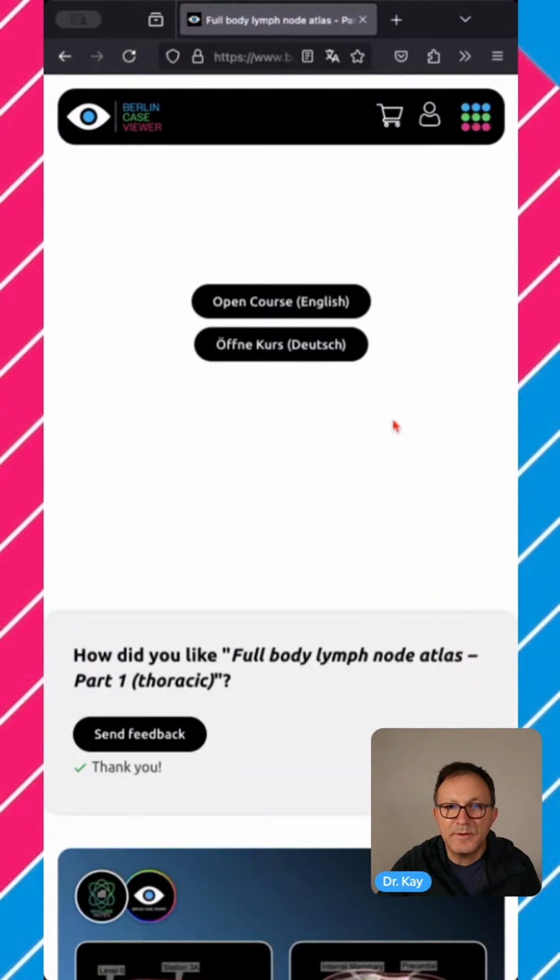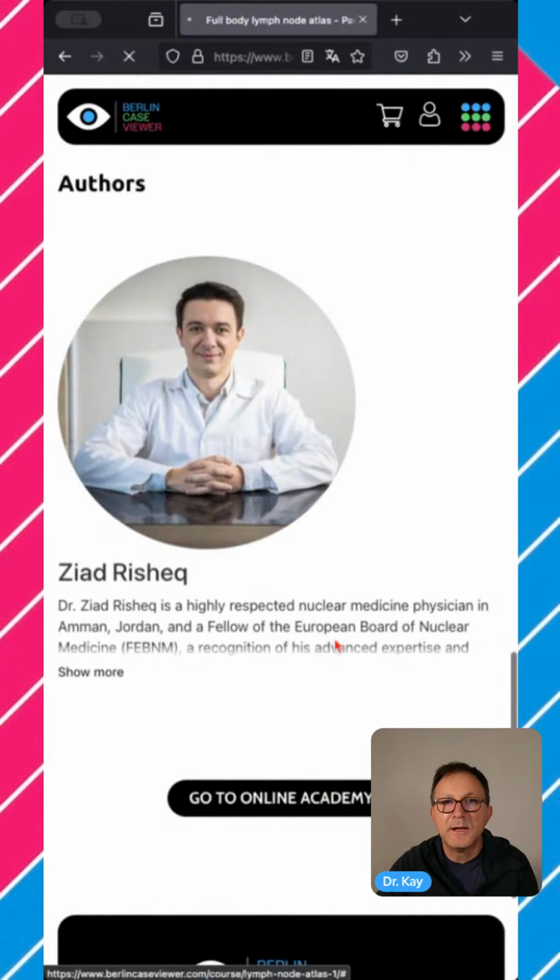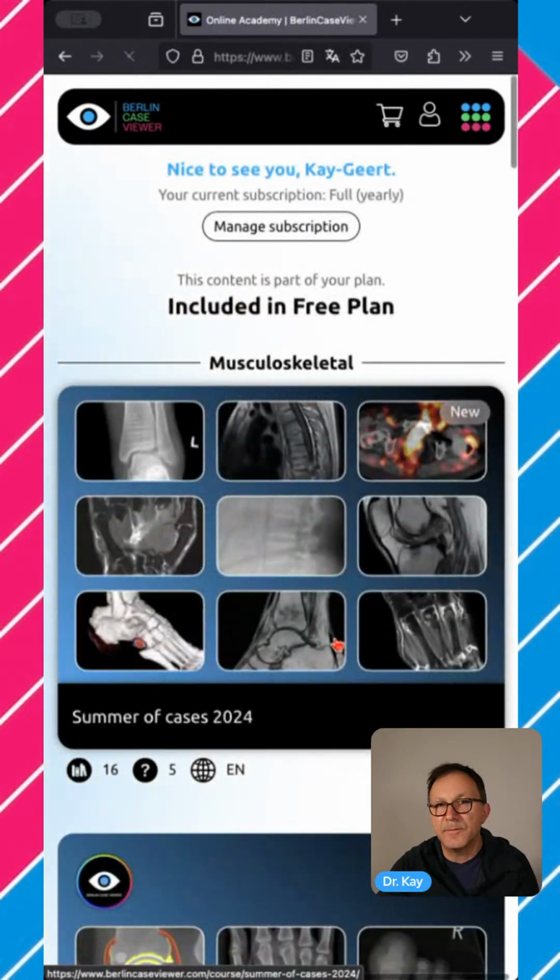But now we are going back to the online academy, and now it's time to demonstrate some cases from the rheumatic field. And I've selected a case from the ankle region, from the lower extremity.